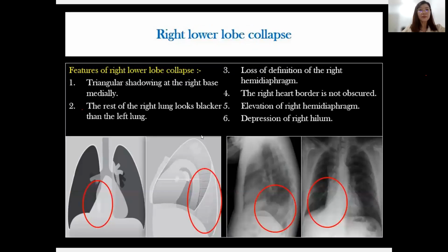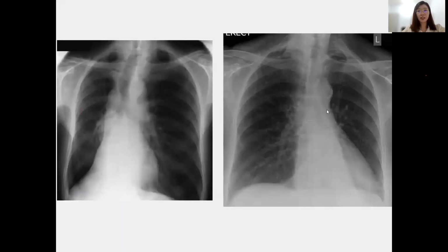All right. So now, what about this? Okay, the next X-ray now. Anyone? Everybody is doing very well. They're paying attention.